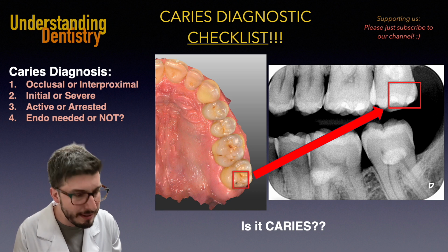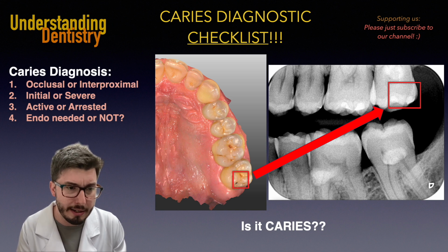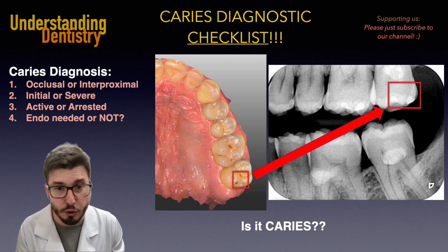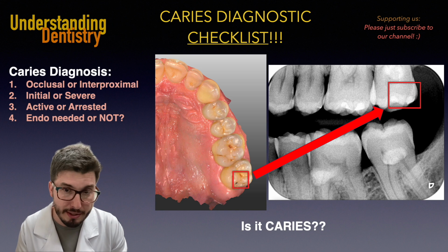Only to complete the analysis of this case, the two restorations of the lower arch are two big class 5 restorations, surprisingly, of the two molars, right? Superimposed to the pulp chamber and even to the cervical areas of these teeth.